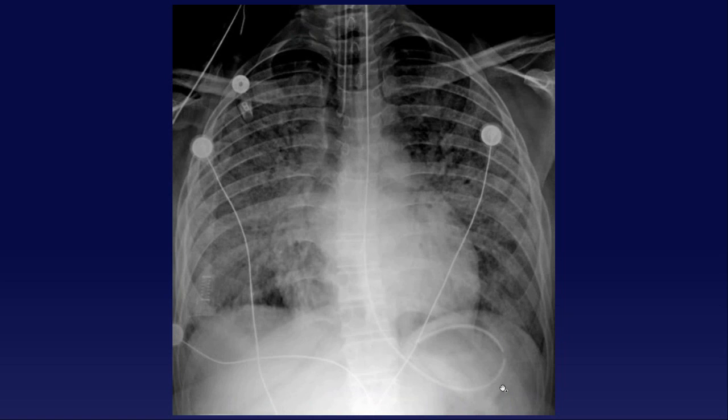You've got your NG tube coming down, circling, and you see this over here, guys? Okay, the tip is there. That's the side hole. The side hole occurs, I think, like 8 centimeters proximal to the tip of the tube. So that's actually a way you can figure out where the tip is. Let's say you've got your NG tube coming down here, you see the side hole, but you can't quite see the tip. If you've got something overlying, you can say, okay, if the side hole is here, the tip's like 8 centimeters farther and it's in the stomach. They still need to advance it, right? Or if you see the tip here, you know that the side hole is above the level of the gastroesophageal junction. It should be advanced and vice versa. Got it? Okay.